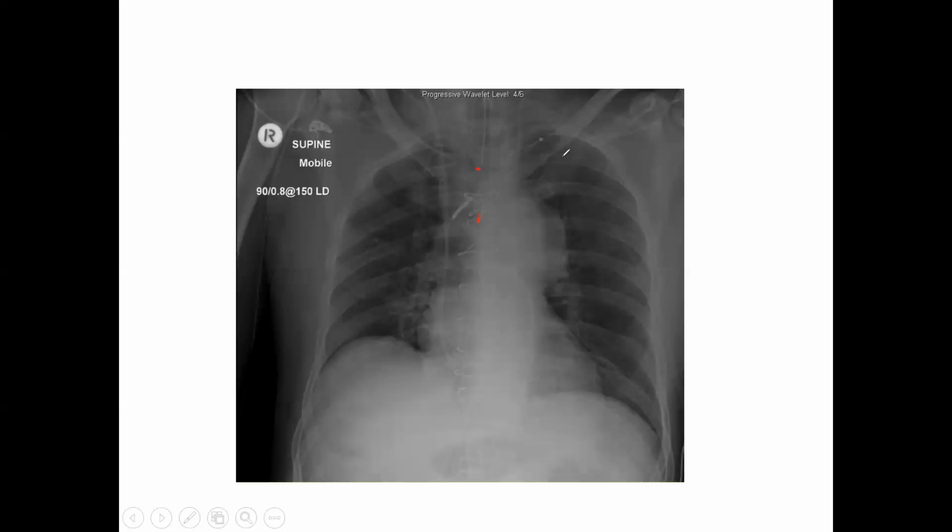So we'll go ahead and clear my drawing here, and we'll move forward to the next one.